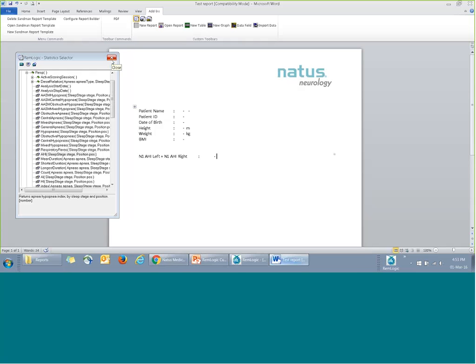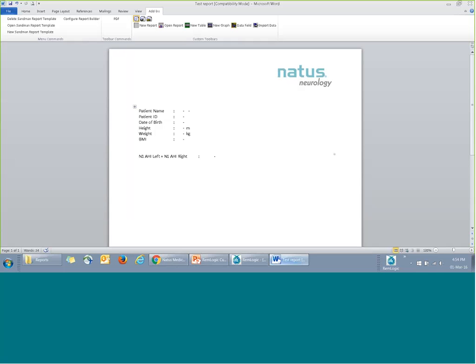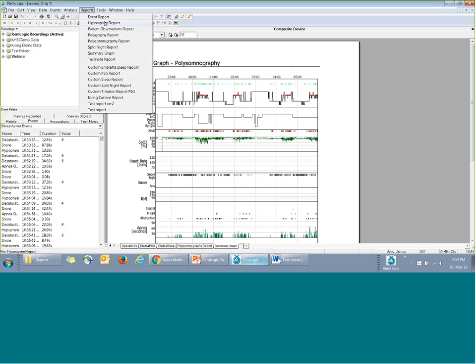Okay, are there any other questions from the floor? Can we customize the default report type? Okay, for the default reports that were installed with RemLogic, all these reports here, we do not have much flexibility. I would say, let's put it this way: we can't do much to change these default reports because everything is in PDF format.